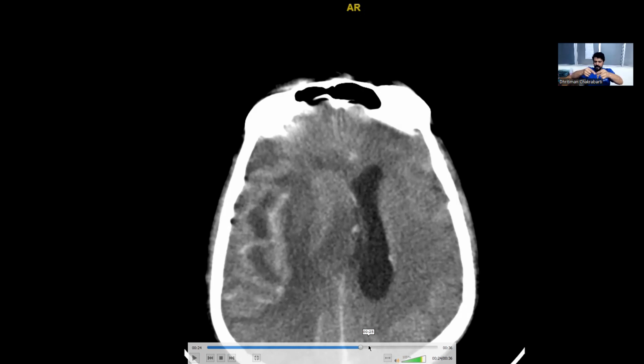Now this third ventricle will appear as a slit when you take a cut section of it. Above that, it will appear as a slightly bigger hole. If the CSF is more, like there is a bit of hydrocephalus, then you'll be able to see it as a hole, and then you'll see the lateral ventricles.